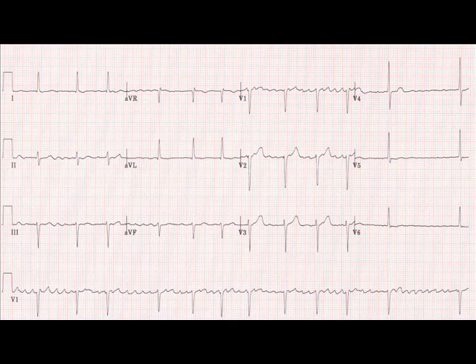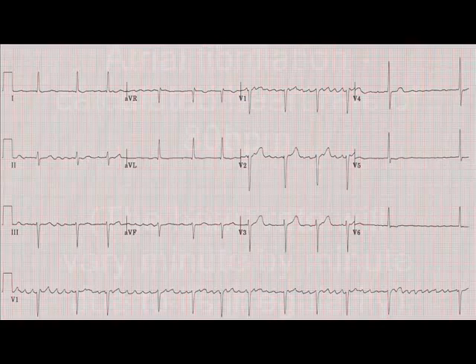You do not have sinus rhythm. Instead, you have this constant churning, electrical activity within the atria. The heart rate is irregular, but the QRS complex is normal, so it's highly likely to be an atrial arrhythmia. There are no other abnormalities, although I'm suggesting to you that the cardiac axis is heading more towards the left.